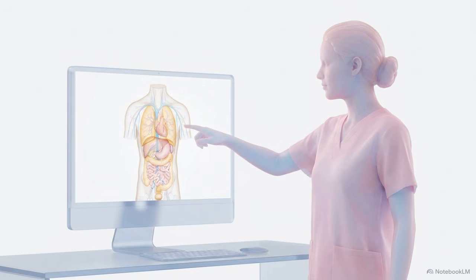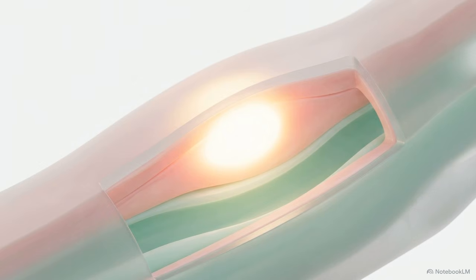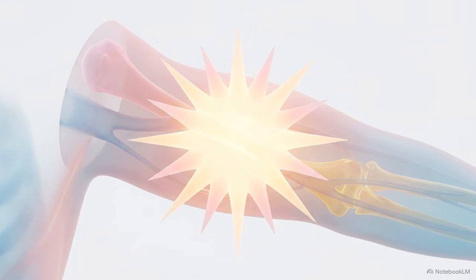Using this pipeline allows for the systematic separation of expected physical phenomena from the underlying biological signals we actually want to measure. The signal begins the moment the radiotracer enters the patient, typically via venous injection. A heavy concentration of radiotracer will pool at the exact site of the needle puncture. This creates an intense localized spike in activity that can easily mask adjacent anatomical structures.